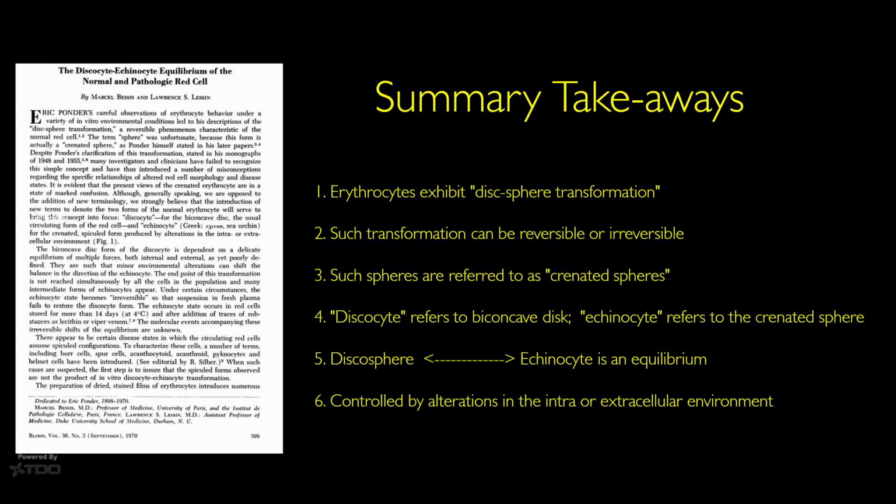And there's an equilibrium between these two forms, and it's controlled by things having to do with the lipid bilayer in the outer cell membrane, which becomes weakened or lengthened because of osmotic or other chemical changes in the environment. So this makes a lot more sense than thinking of them as mesenchymal stem cells or a non-cellular form. They are definitely cellular, and these are definitely red blood cells that have been changed somehow by the Triton.